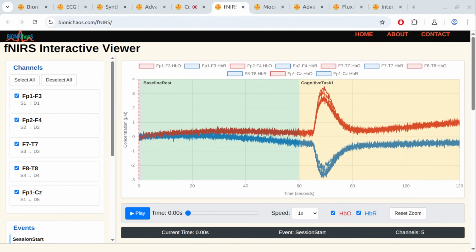The other functionalities seem to be working fine.